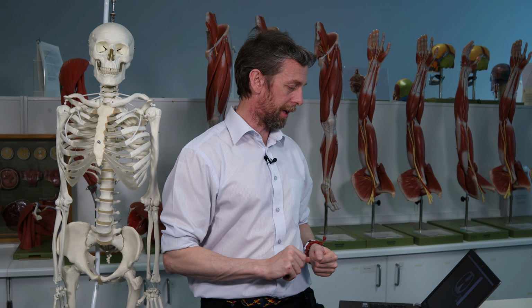And if you're going into a profession where you need to be able to recognize these images, the more you look at them, the easier it becomes, right? It becomes second nature and you just start to recognize stuff.